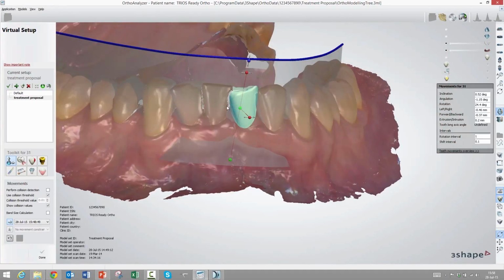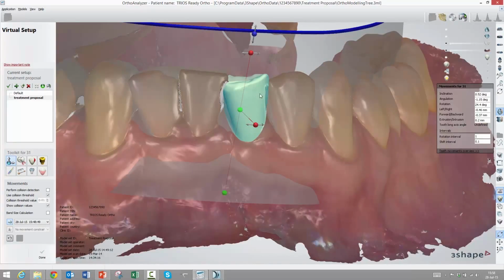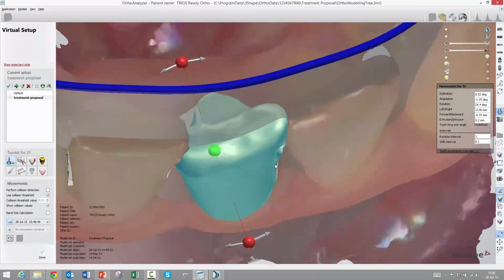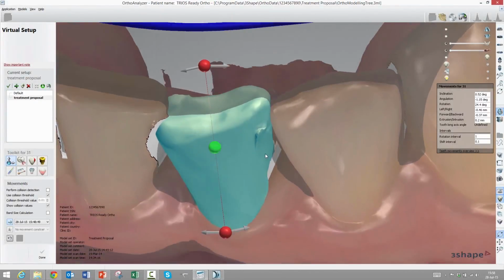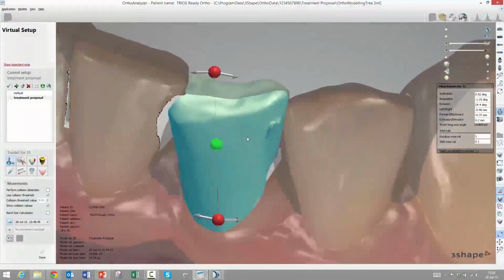All right, so I'm just doing this briefly. You can see the color information is not on the areas that I'm exposing. Another thing that's quite important: you can see the segmentation of this tooth was kind of rough, and that's on purpose. That means we don't invent geometry we don't have. So we have a tool for this. When you do the segmentation and you have a situation like this, you can smooth the tooth edges. You do it beforehand because you know you're going to expose this area of the tooth.